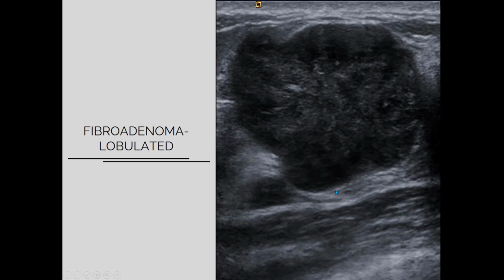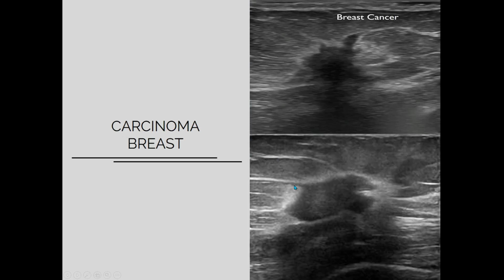This is not very well rounded, there are lobulations, but even then it is quite different, more angulations. See how pointed they are. The other thing is that you can feel infiltration. You can see this is spiculated. It has angles and things coming out, so this is quite suspicious.